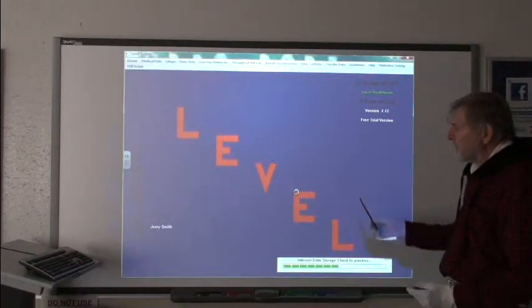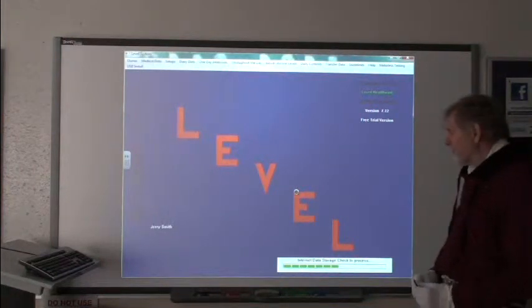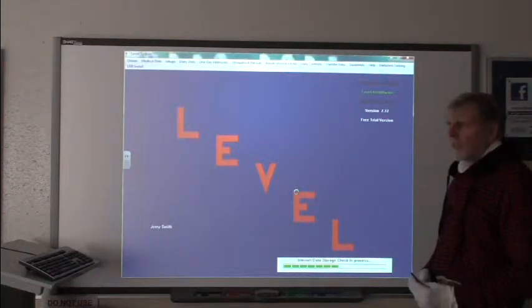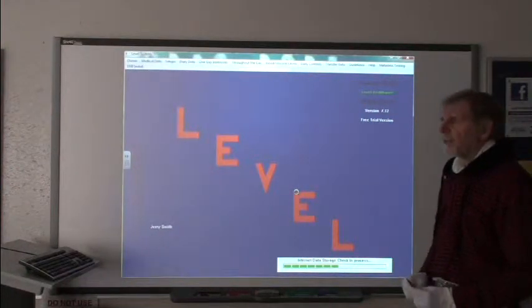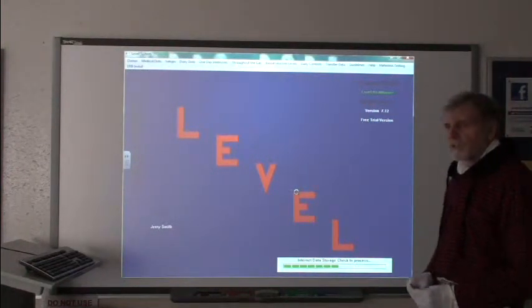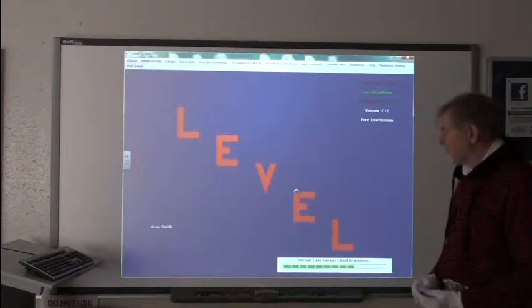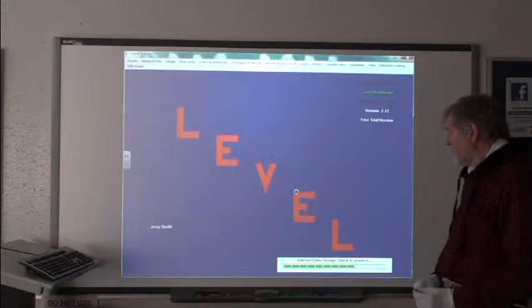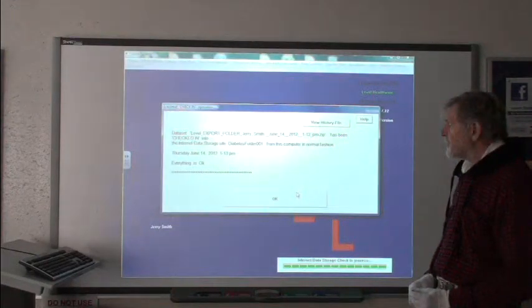So what it's doing now is making a final check-in back to that internet data storage location of the current data set in this computer, as you may have made some changes to it in the last few moments, and it wants to leave that internet data storage location in a very orderly fashion, so that the next time you connect to it, it will be up to date with your computer as it is at this particular moment.